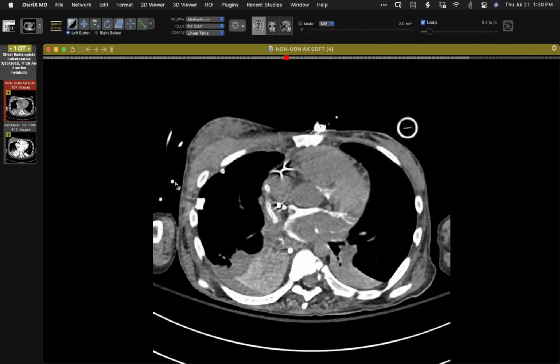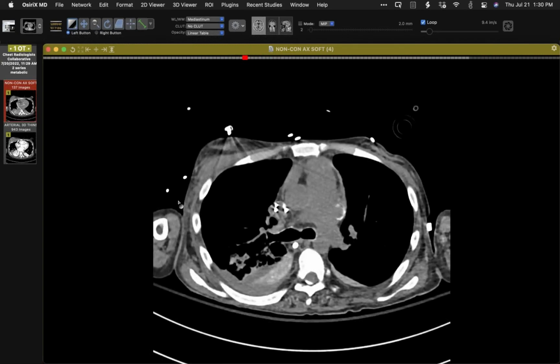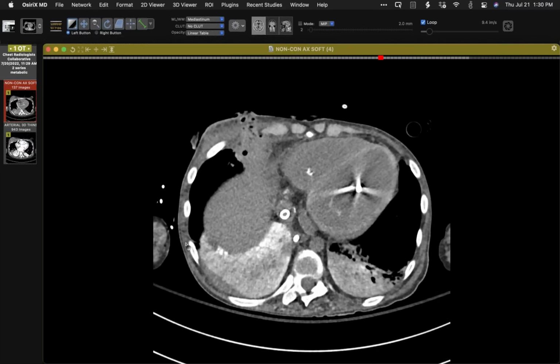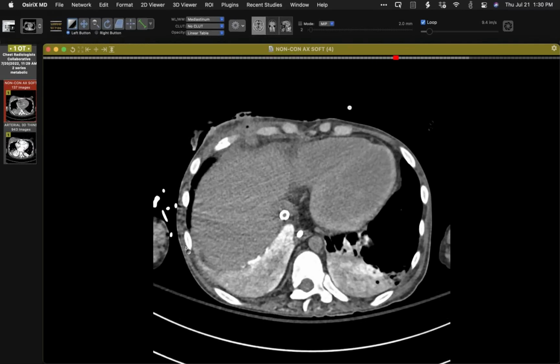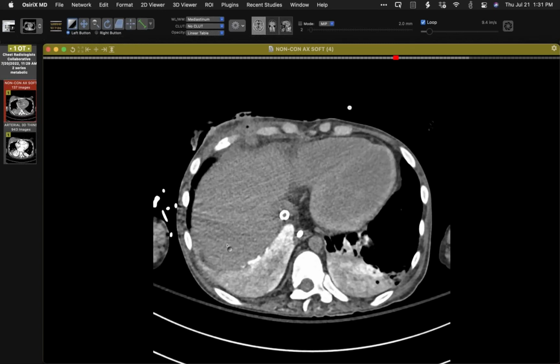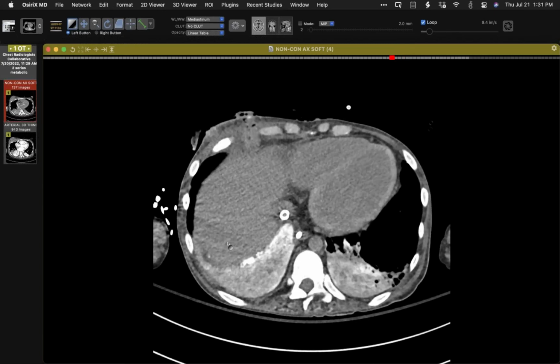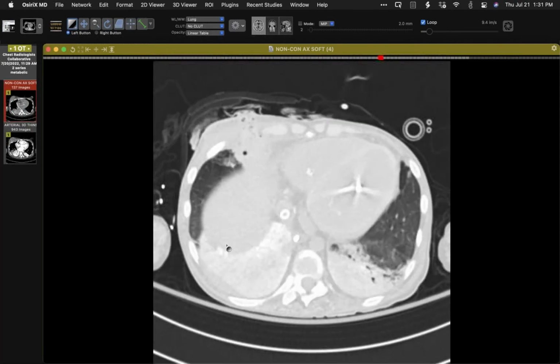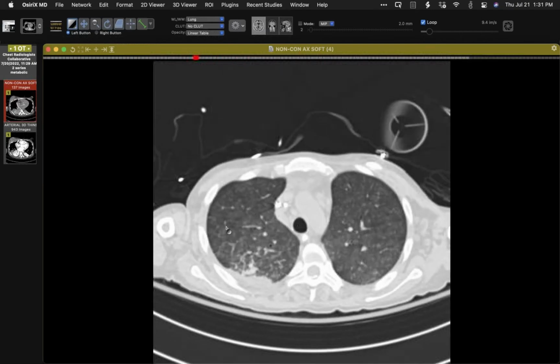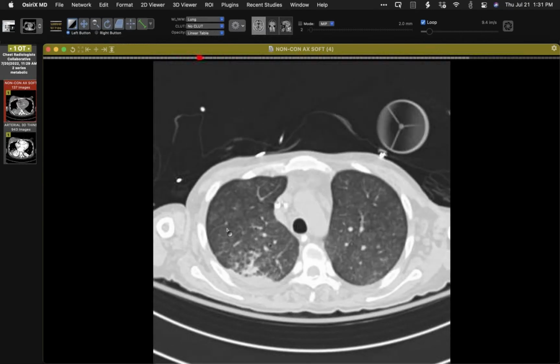What I want you to look at here on this non-enhanced CT is the appearance of the lungs down here. So no contrast medium, and the lungs are intensely white down here. Now I will switch over to show you the aerated upper lung zones that look like that.